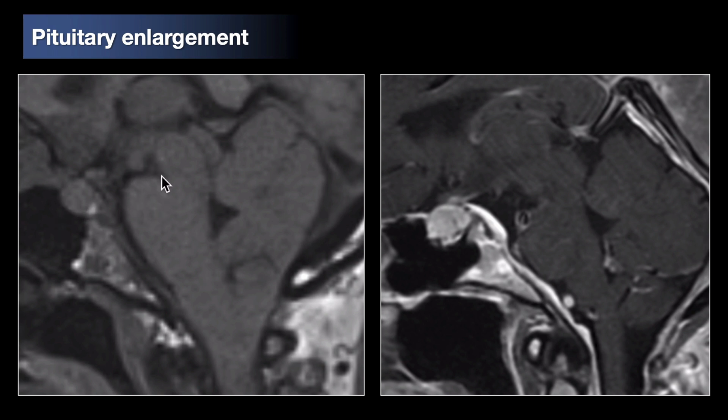So here we can see that narrowing of that mammillopontine distance, the flattening of the ventral surface of the pons, the narrowing of the prepontine cistern, the cerebellar tonsillar descent. Here we can see that dural thickening and enhancement running along the clivus, the posterior fossa into the spine even, and you can see here the venous sinus distension. Now, those findings that I've described, those key findings of SIH, may be present to varying degrees, especially in chronic leak patients. There are a few other clues we can look for.